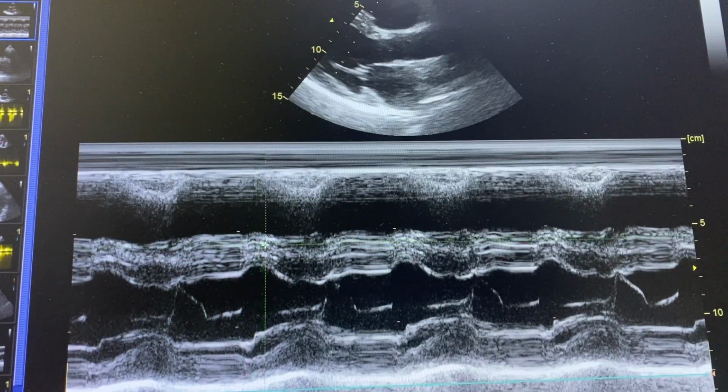It is consistent. It goes down. It moves up again. It goes down. It moves up. You see, it is consistent, but this one, whenever there is a systole, this one remains up and creates some space here. It doesn't move. In systole, this one remains up.